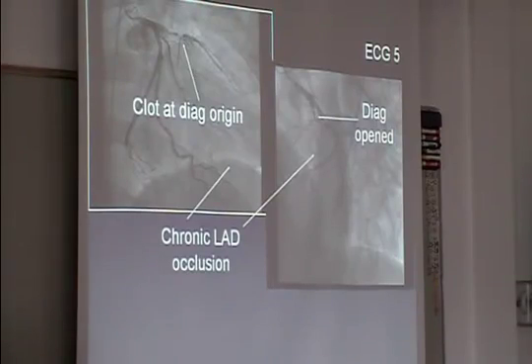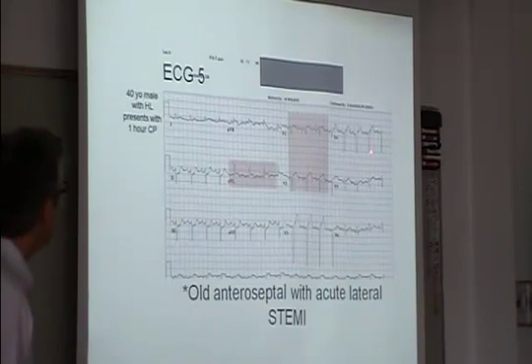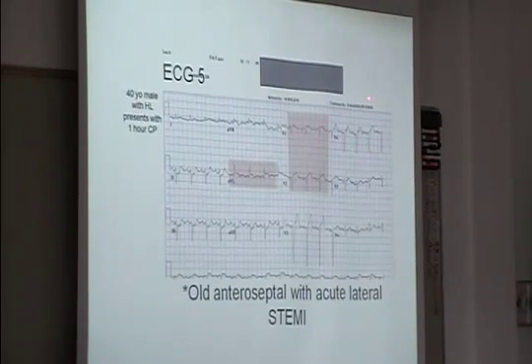Can you go back to the 12 lead again? Yeah, sure. Is V4 not showing elevation? From here it looks like no, there is a lot of elevation. I'm sorry.